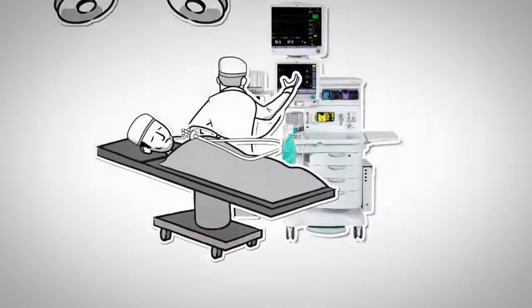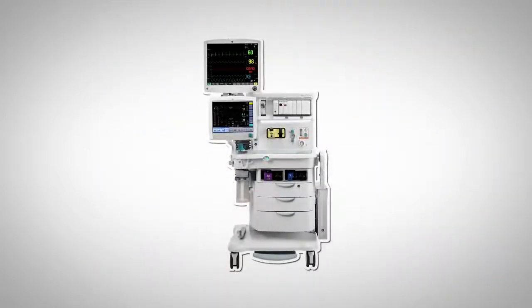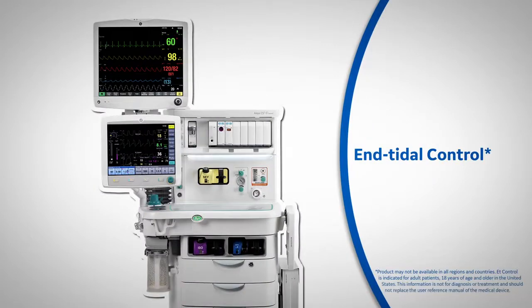These manual adjustments can increase the anesthesia provider's workload, which can become time-consuming and take away from patient care. What if you had a tool that could automatically adjust your fresh gas concentrations to quickly achieve and maintain target end-tidal oxygen and end-tidal agent concentrations, regardless of patient changes in metabolic status? Then end-tidal control may be your solution.